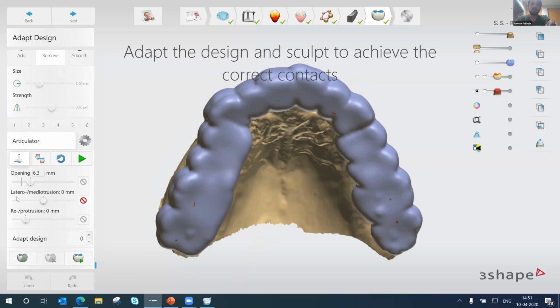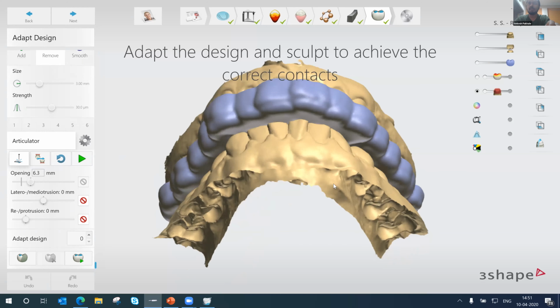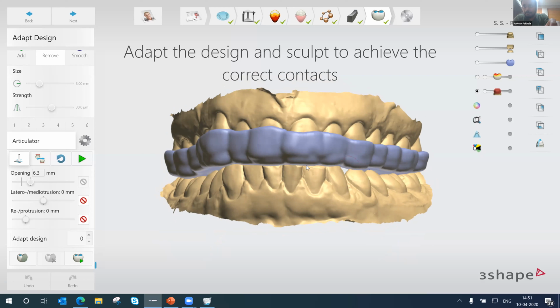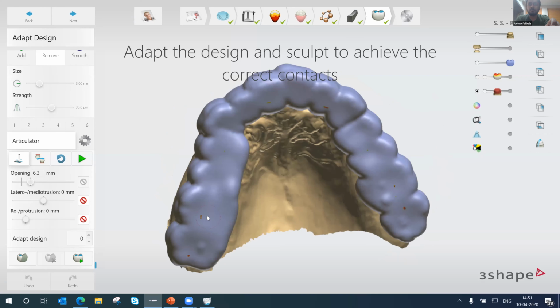deactivate lateral protrusion and retrusion. So I'm just going to deactivate this and see what happens. Over here, I'm going to do it guided by the incisor table right now. And now all I'm going to do is click. What is happening over here is the system is trying to find exactly where the points are, and if they are touching, it will give me all those points. Here, you can see very few points which are connected, very minor.